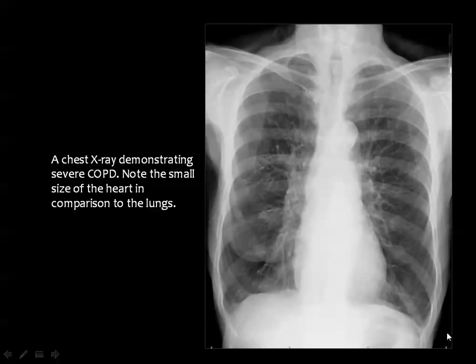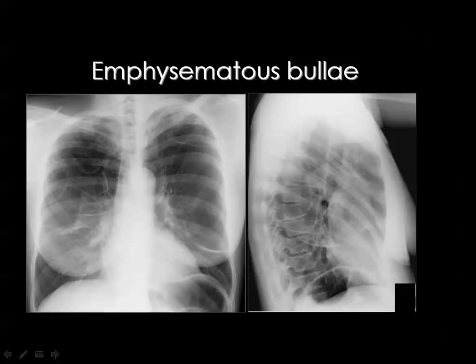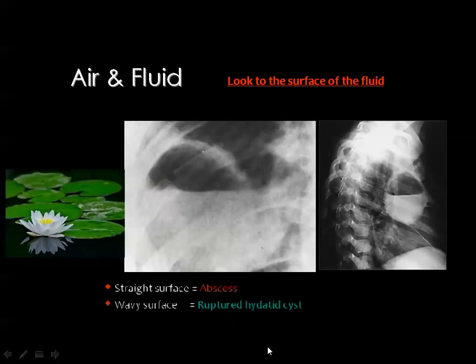And this is a good example of a pneumatocele in the apex of the right lung. And this is what we call chronic obstructive pulmonary airway disease, with hyperinflated chest, low flat diaphragm, ribbon-shaped heart, enlargement of the hilar shadows, and peripheral attenuation of the vascular markings. I will discuss this in full detail in the topic of diffuse lung disease. Then this chronic obstructive airway disease may be associated with emphysematous bullae or not. And you see here gross multiple emphysematous bullae in both lung fields, both in the lateral and the frontal view.